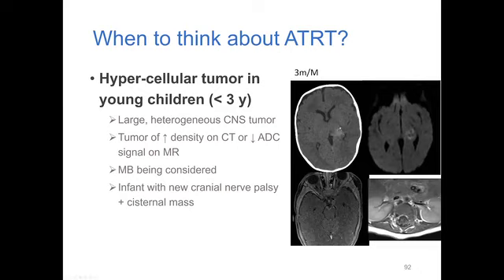You see a mesial temporal tumor, CT shows high density, meaning high cellularity, and diffusion shows restricted diffusion. I did not show the enhancement of the tumor, but believe me, it shows heterogeneous strong enhancement. What I want to show here is that you can see some leptomeningeal enhancement even along cranial nerve 3. And the spine image also shows some spinal seeding. So this is an ATRT case.